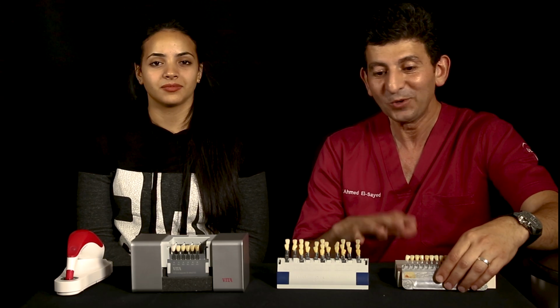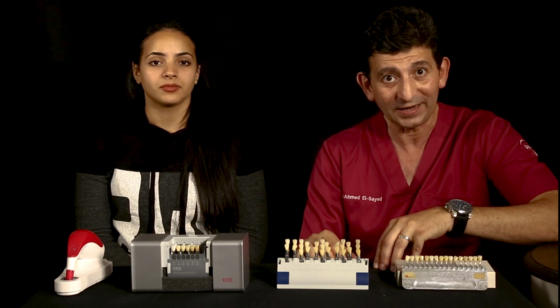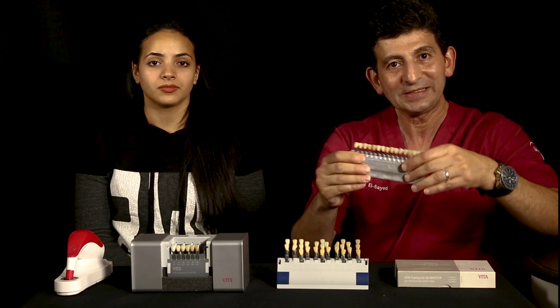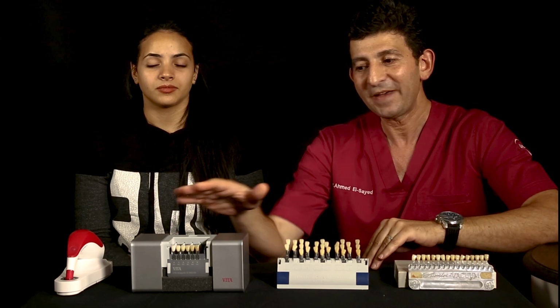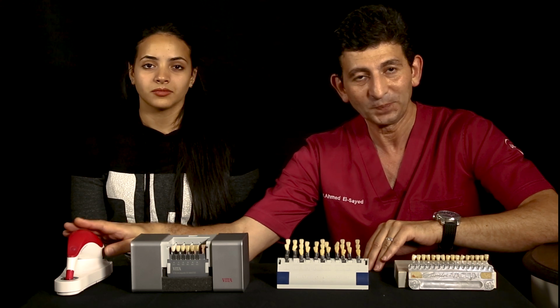Hi everybody, today we're going to talk about 4 different systems that are commonly used in our clinic: the hue-based shade guide, the 3D Master, the value-based linear shade guide, and the spectrophotometer.